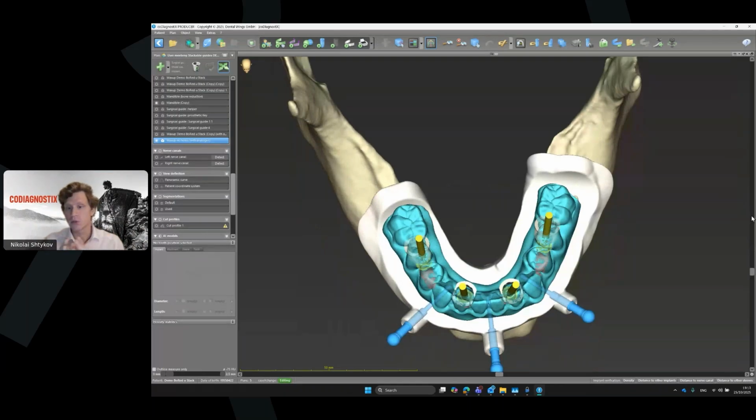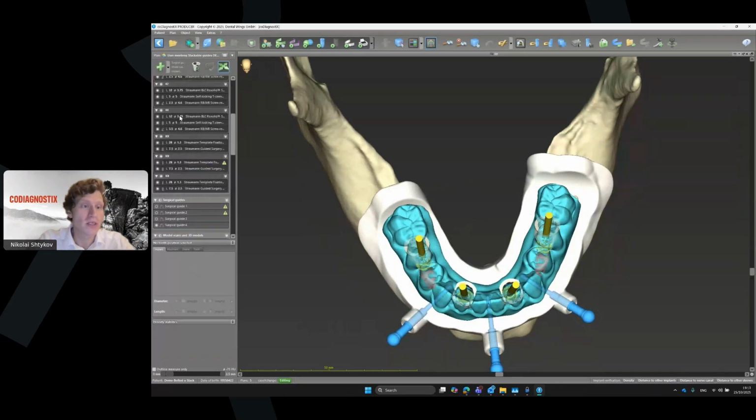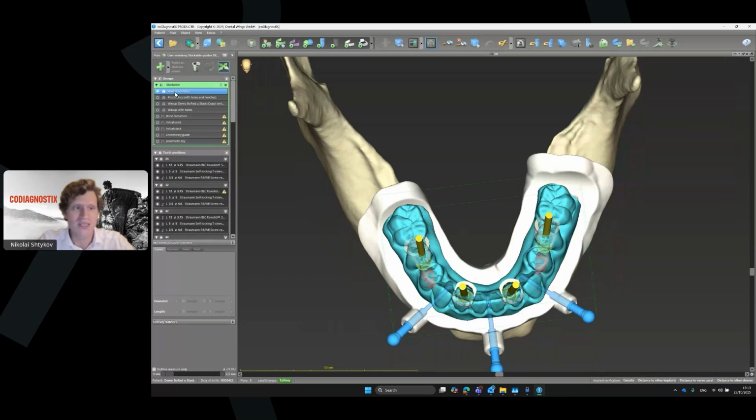For the cage, we need one more model. It will be designed in the same way, totally the same. So I need to have the same model with no holes, or the model as I just created. Let's make a new one where it is convert to model.